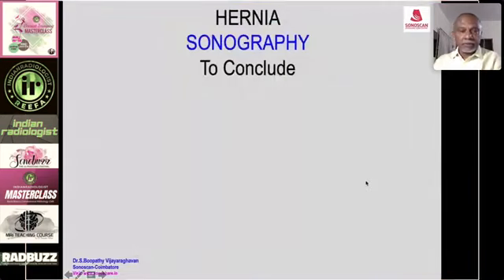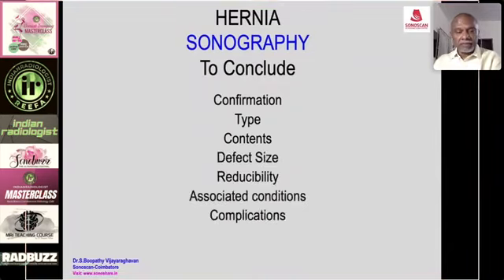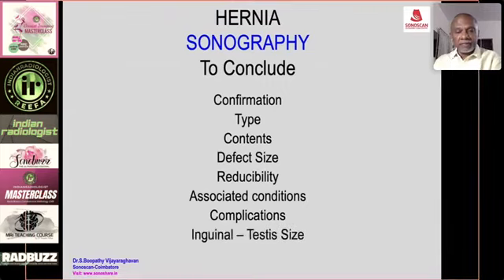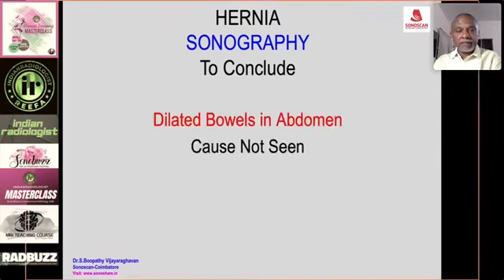To conclude, the role of ultrasound is in confirmation, to know the type, the contents, the defect size, reducibility, associated conditions, and complications, and you have to document the testis size in inguinal hernia in males. And if you see dilated bowels in the abdomen and the cause is not seen, you must look for hernia as the cause.